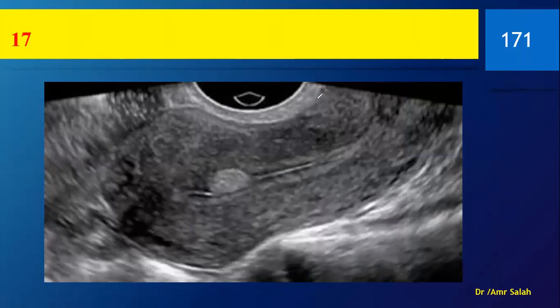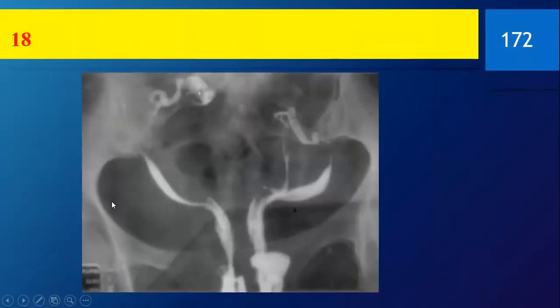I have this uterus here. Okay, and this is the endometrium, and I see this lesion. This is, yeah, bravo, an endometrial polyp. Okay, next. This is a hysterosalpingography, and I had to inject the patient twice. So this is clearly a case of uterus didelphys.